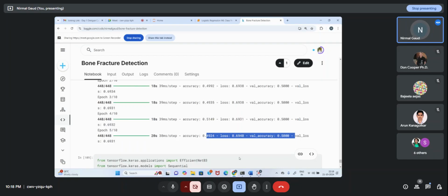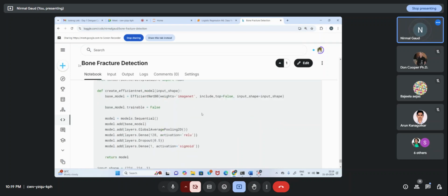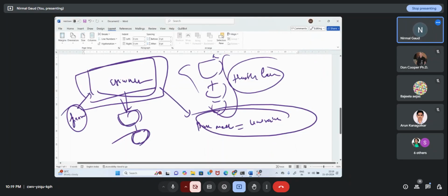Then I dropped the idea of using the B0 model and proceeded ahead with EfficientNet B3. मैंने आपको पहले ही बोल दिया, EfficientNet के वर्जन हैं, B0, B1, B2, B3, B4, B5, B6, B7, इतना तो मेरे को पता है. So B7 is a heavy model, the biggest of all. So I took intermediate EfficientNet B3. एक और नई चीज ऐड करिए. There is one more new thing I added: Gaussian noise. देखिए क्या हो रहा है, अभी नॉइस पे भी काफी ज्यादा काम हो रहा है.